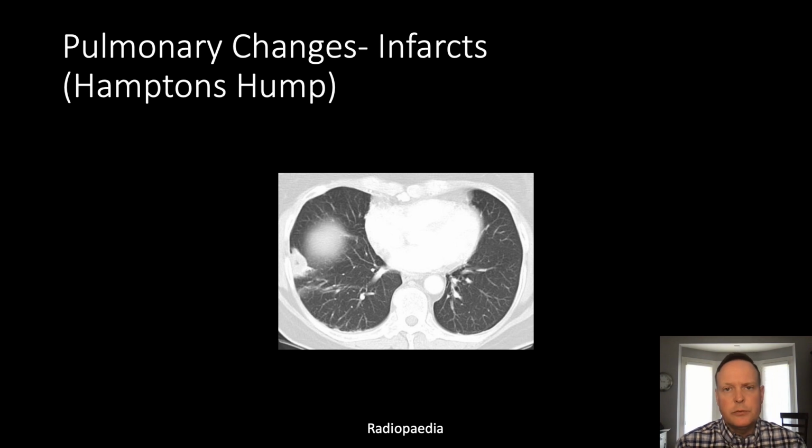When you have an occlusive pulmonary embolism, you can develop a peripheral infarct. So what we're seeing here is a peripheral consolidation secondary to that infarct. Generally, infarcts have associated hemorrhage with them, which causes a filling of the bronchi, so you will not generally see air bronchograms. Also, you tend to get a central kind of bubbly lucency to these peripheral consolidations on CT. On chest radiograph, this would appear as a peripheral consolidation, which could look like a pneumonia or even a mass.